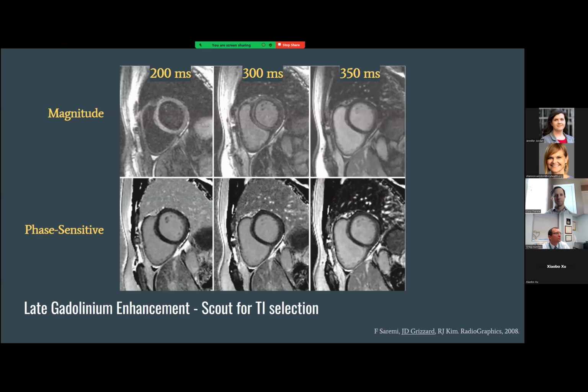If the inversion time is too long, on the other hand, the magnetization of the normal myocardium will be above zero, and then you're dealing with normal tissue being gray again. So we're really looking for that optimal time when the healthy myocardium is black and the infarcted or diseased myocardium will light up a little bit better and give us that visual appreciation between the tissues.